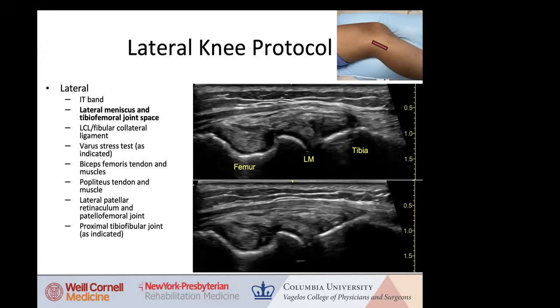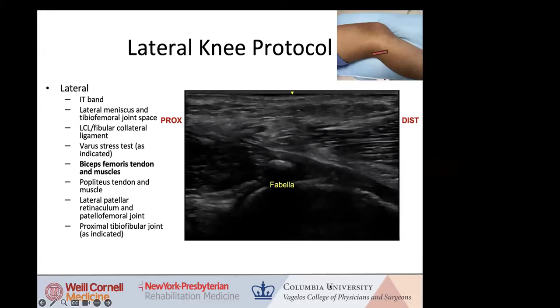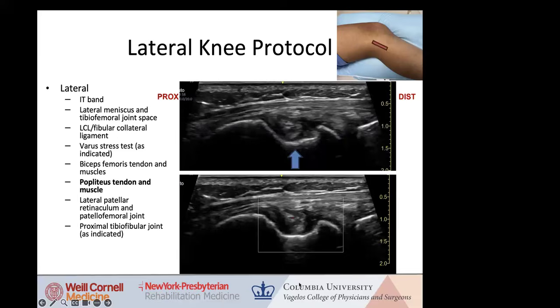The other thing to consider when looking at that image is that the lateral recess of the knee oftentimes will have fluid in it. So not to mistake that for focal fluid and an injury, but that is part of it. Medially it's pretty tight, and we typically don't see fluid in the medial recess. We do see it in the lateral recess.